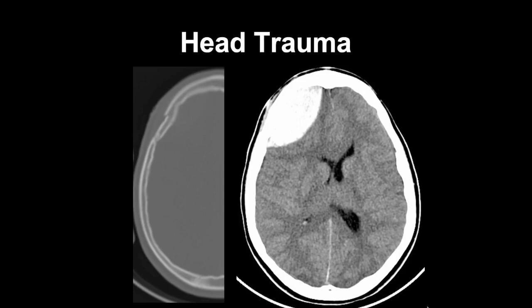There are different features that make this a typical epidural hematoma. So the first feature is that you can see that there is this biconvex shape to the hematoma. So that's very typical of an epidural. Another feature that is typical also is the association with a fracture on the side of the hematoma, because typically the epidural hematomas develop at the site of the coup, which is where we see it here, underlying the fracture.